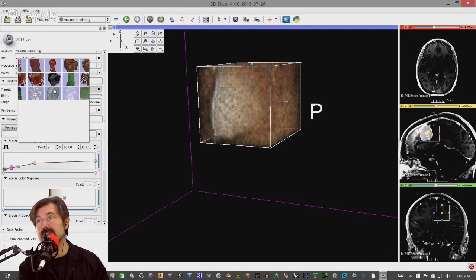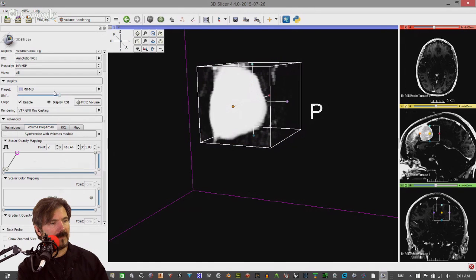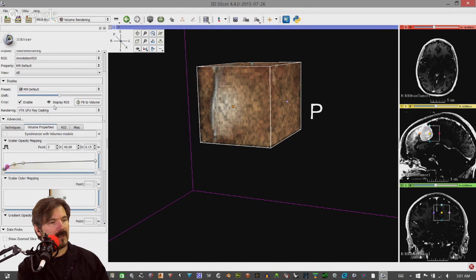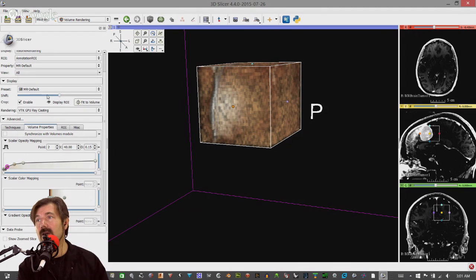I'm assuming there's some reasons for that, Jevin. Maybe you can enlighten me. Oh, you're saying why would you want to use the different coloring? Different coloring. In fact, some of these are standardized, and I've seen them in other packages. Like some of these CTs use false coloring of certain colors. I'm assuming from a radiology perspective, there's a reason for that.